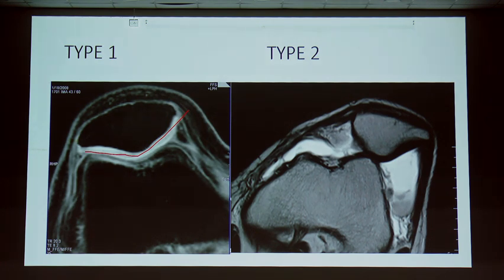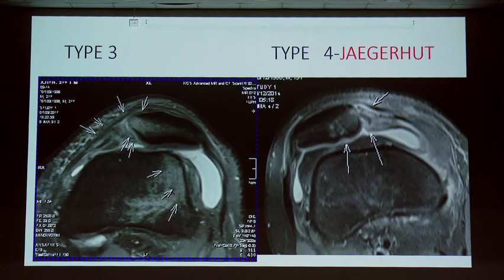And you can see that here the medial facet is very small. You can see the lateral facet, it is becoming a 25 to 75 ratio. And you can see still less. You can see the medial patellar facet is very small. Lateral is becoming more. Here there is only one articular surface. There is no second articular surface. So these are the things we have to look at carefully when we are evaluating the patella.